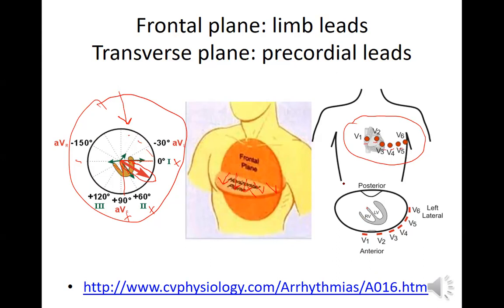We're going to go over the mean P vector in another lab. So today we're talking about the mean QRS, and QRS is ventricular depolarization. So again, draw that, draw the SA node, draw the arrows as best you can. And sometimes it's not perfect. And you can see where they have that transition.